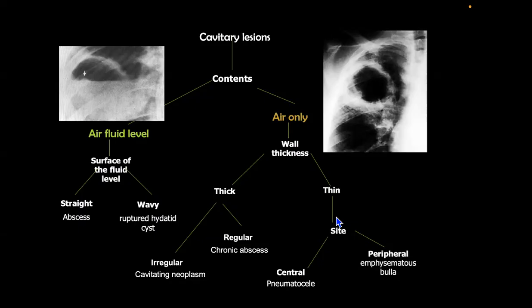So we ended up finding massive PEs and massive superior mesenteric vein thrombosis. But again, concerning the chest radiograph for the supine patient, because the ICU patient is a supine patient, we do it using the portable machine.